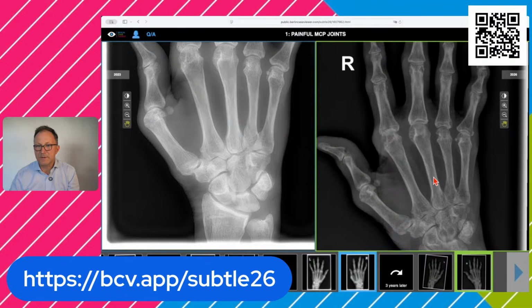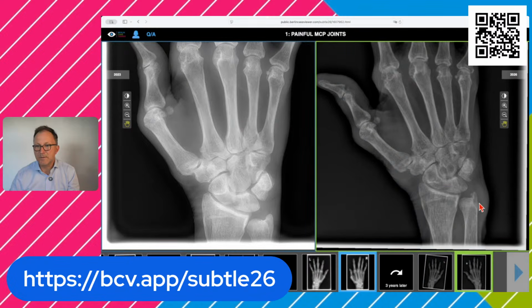We have now severe bony destructions. We have here now soft tissue swelling. We have destruction of the bone, and we also see the carpal bones, the capitate, the lunate, which have large defects that were completely normal three years ago. So this demonstrates a little bit the challenges that we face in our attempt to diagnose arthritis timely and early.